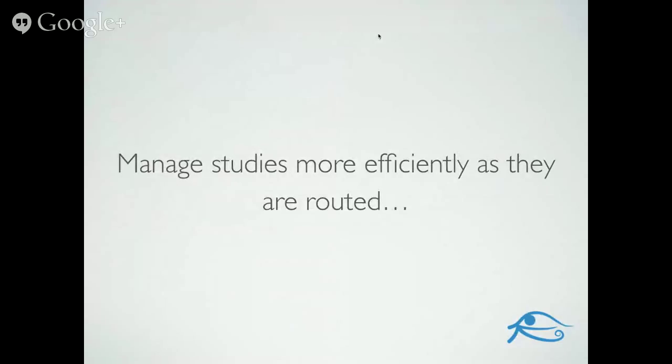A number of our customers use OsiriX beyond just being an image viewer. They use it to manage studies more efficiently in their practice. In a lot of cases, OsiriX is a wonderful image router. So when it receives images, perhaps studies have been ingested off of CD or DVD, perhaps they've been sent to an OsiriX workstation or server, OsiriX has the ability to intelligently route those images to other locations.